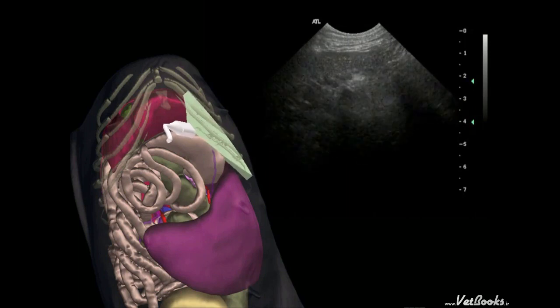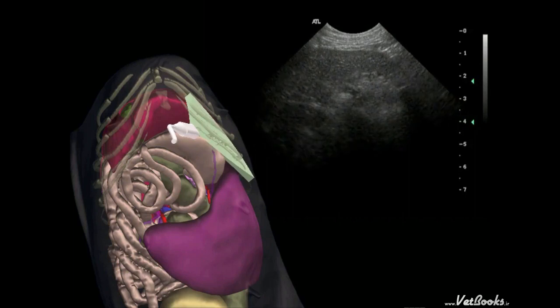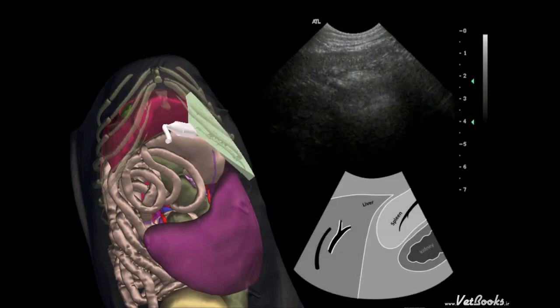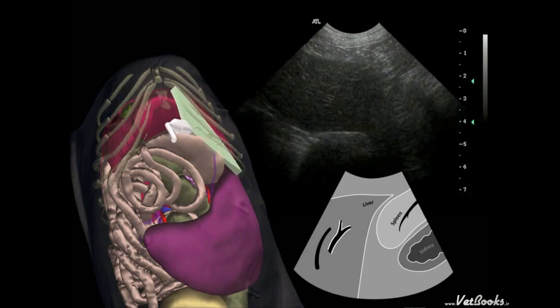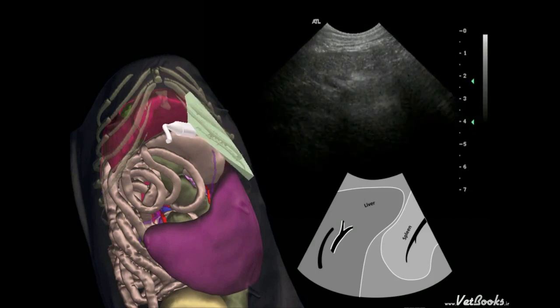The shape of the caudal tip of certain lobes, such as the left lateral lobe, provides information on the size of that lobe and the whole liver if the infiltration appears diffuse. In this illustration, the normal lobe has a pointed end where it touches the spleen. In hepatomegaly, the edges of the liver are rounded and extend even further caudally with respect to the costal arch.